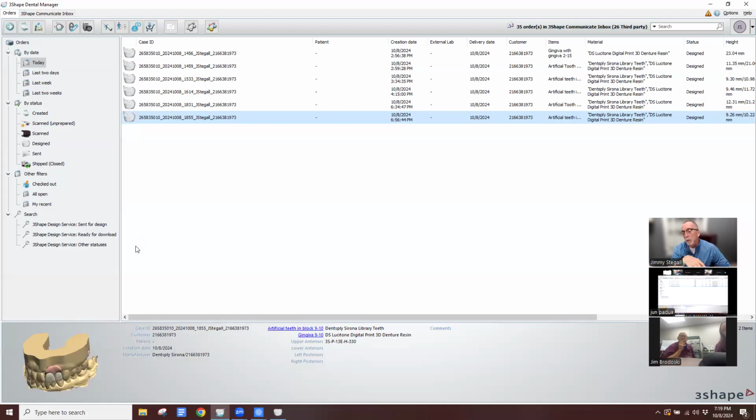Now, I would prefer, if I had the model with the locator abutments in it, to go ahead and snap on the locator scan caps, right? Because the locator scan caps create the ideal amount of space for the pickup of the housings, with an undercut already built in. So that's the easiest way to generate the holes in the denture. But we don't always have that, right? And the doctor may not have done that. So we might have to do it a different way, and I'll show you how I handle that.